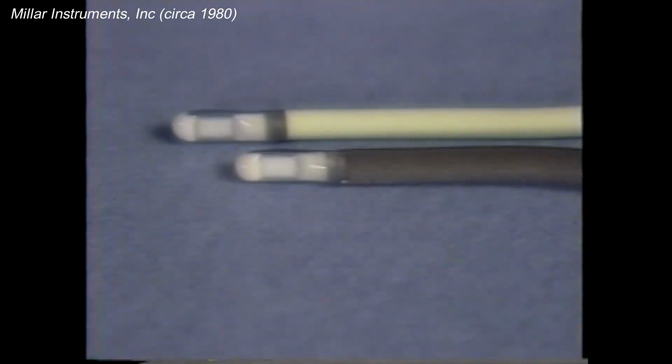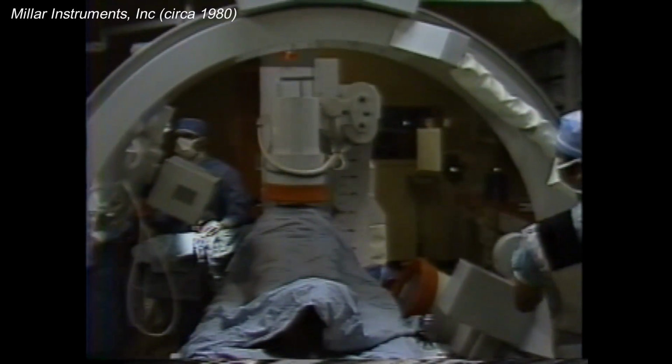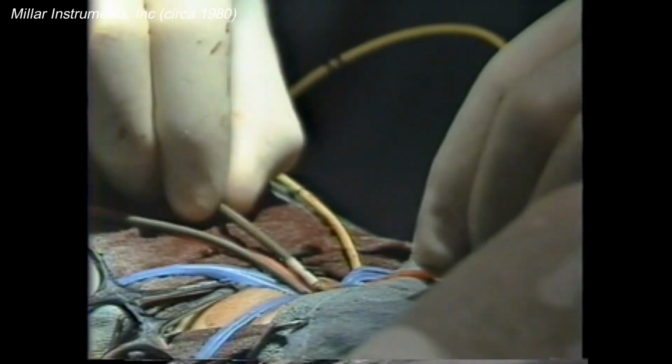As a result, Millar catheter-tip pressure transducers are the highest quality, most technologically advanced, and most accurate devices available for measuring physiological pressures. Physicians and researchers in hospitals and research facilities around the world attest to the superiority of Millar Micro-Tip catheter pressure transducers.